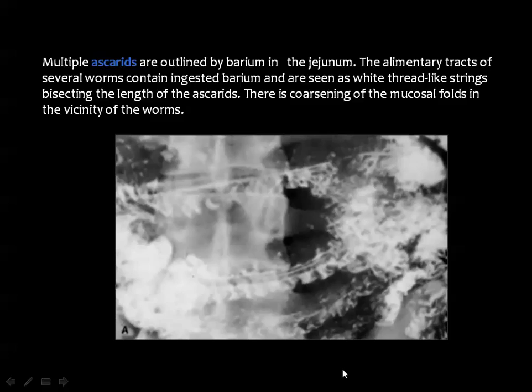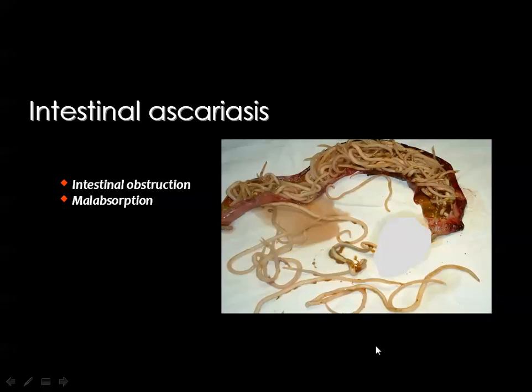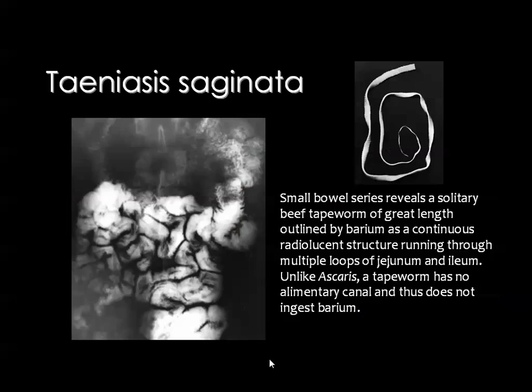This is a common finding in the barium studies. And the parasites may lead to intestinal obstruction and may also result in malabsorption.